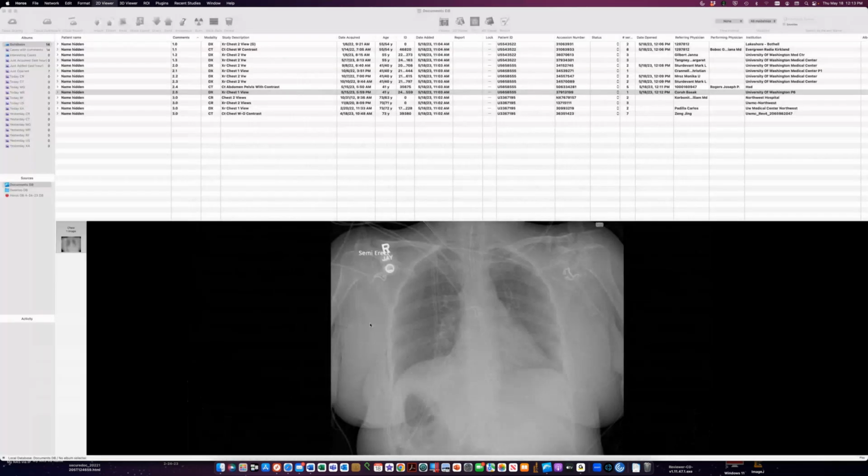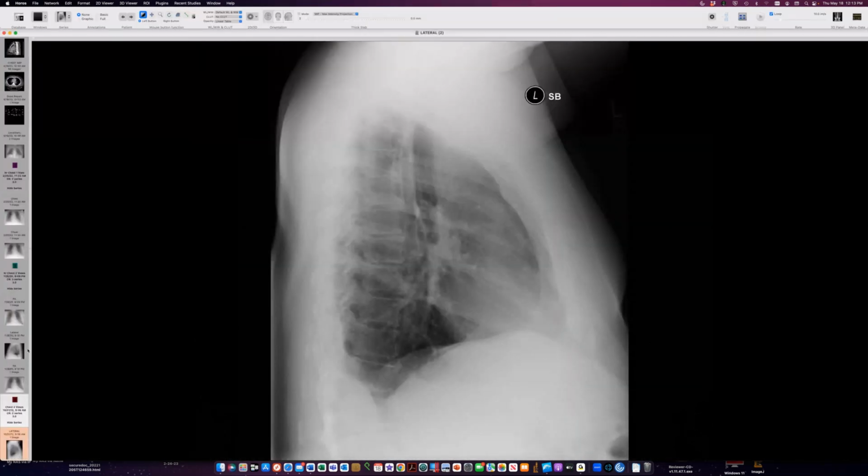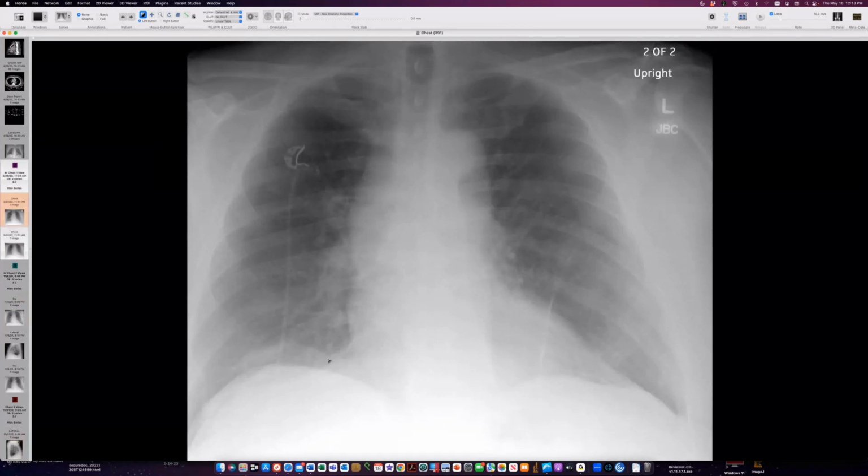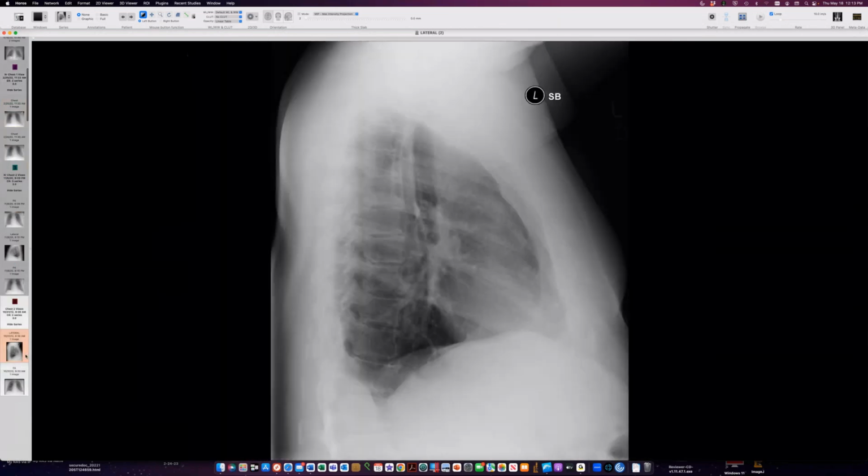Okay, and then I would like to show you this case. This person has, on a few radiographs, you get the hint that there's an extra contour going on back here. And then on some lateral views, there's some variable abnormality posteriorly. We seem to have this convexity sort of interfering with the costophrenic angle posteriorly. On one side, we don't have a very good angle. We have not concavity, but we have a blunted angle on both sides, actually. And then let me show you what this looks like on CT.